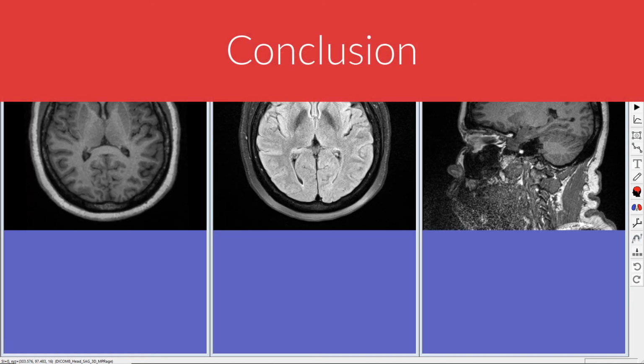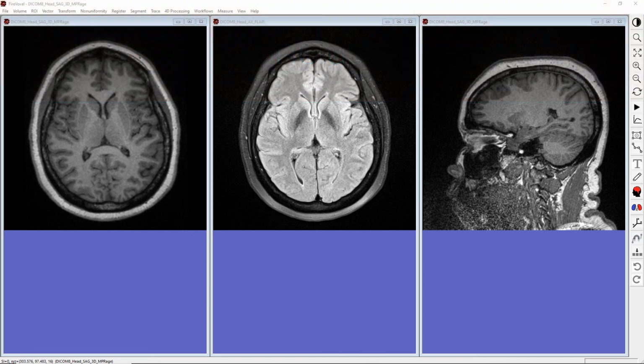This concludes this brief description of FireVoxel's basic coregistration option. If applicable, this command provides fast and accurate image alignment. For more complex scenarios, FireVoxel offers comprehensive tools for 3D and 4D coregistration.